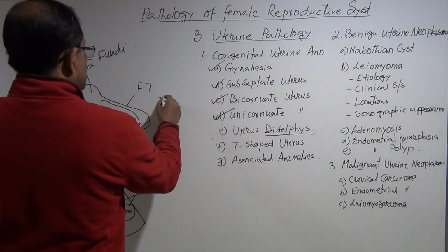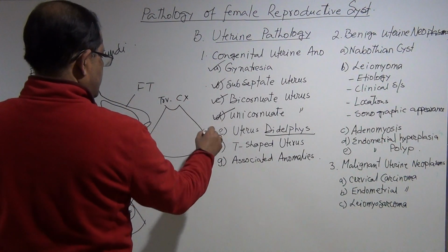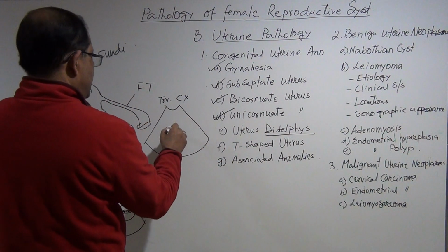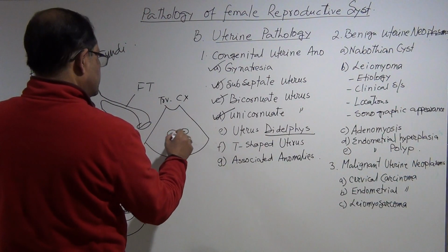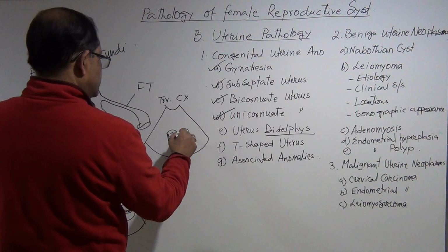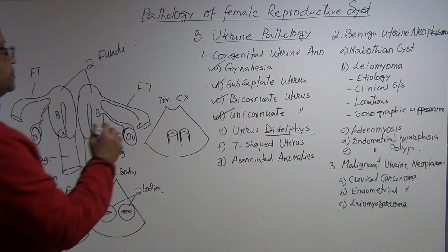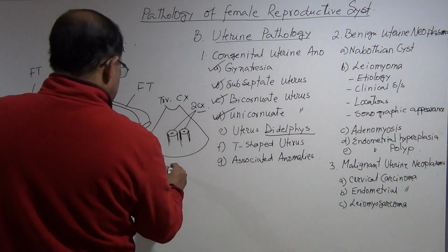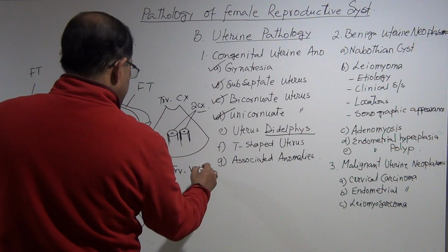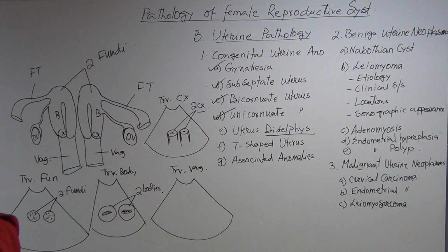Then you will see the transverse cervix, there will be two cervixes, and there will be the transverse vagina.